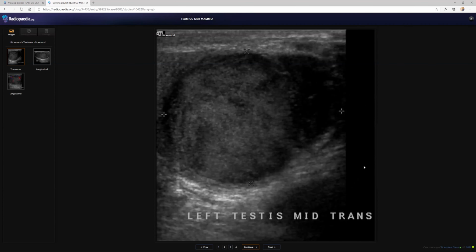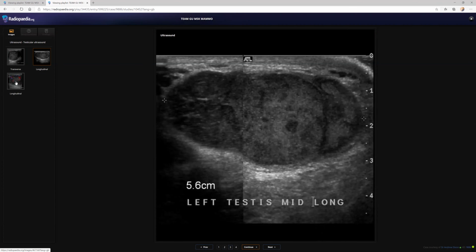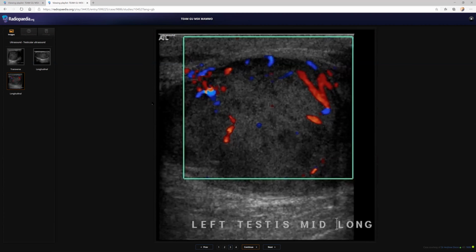Okay, fine. So that's the left testicular mass that's surrounded with a heterogeneous appearance. I want to look for the vascular images as well. Yes. Okay. So there is an internal vascularity. However, it shows rounded walls with slight thickening, and it looks heterogeneous. No evidence of any cystic component.